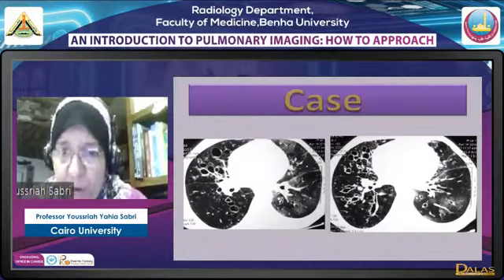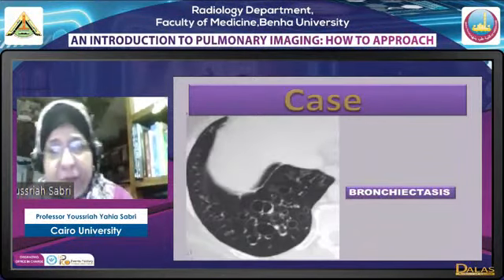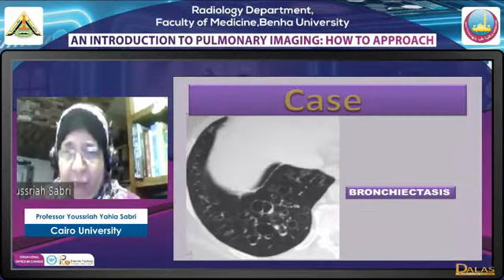We have cystic bronchiectasis mostly in the middle lobe, and we have an early signet ring sign in the left lower lobe. Now again, we have seen this before. This is cystic bronchiectasis, and to remind you, this is cystic bronchiectasis because we have cysts surrounded by marked oligemia.